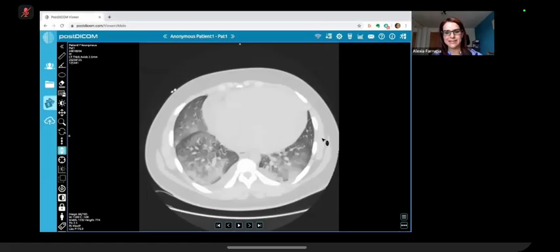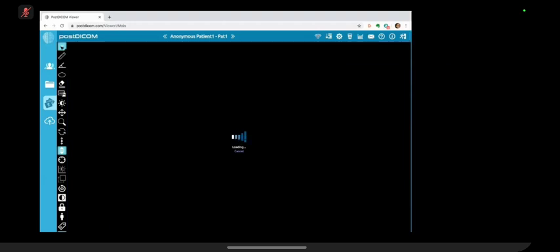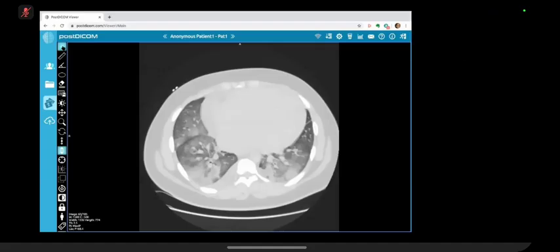I will change the window. Sorry, your voice got cut there again, so I couldn't really understand. I'm going to change the window now. Can you hear me? Yeah, I can hear you now. Okay, I'm going to show you the heart.